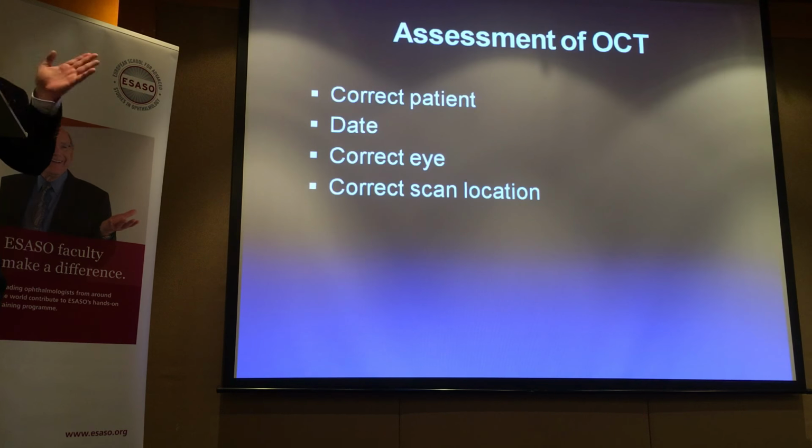It's right and left, you have a 50% chance of guessing correctly anyway. But the fact is that some people do get confused. How many times have people been thrown off by a fundus photo taken on the nasal retina and they mistake it for the other eye? So be careful of that.